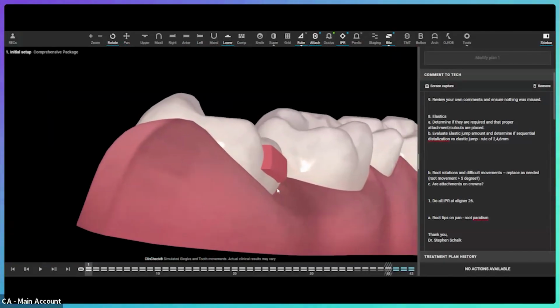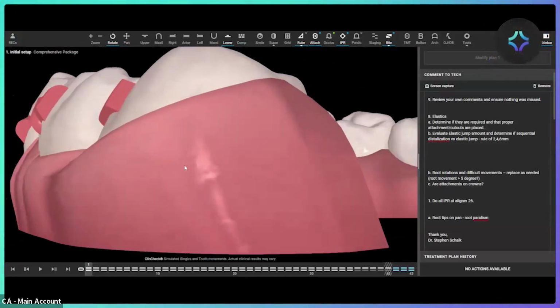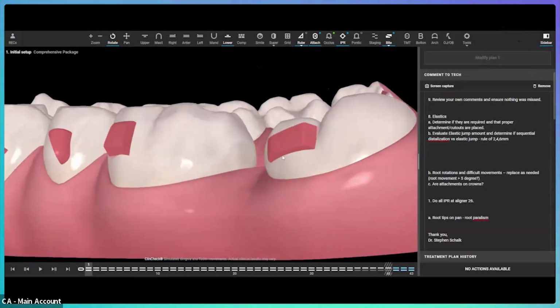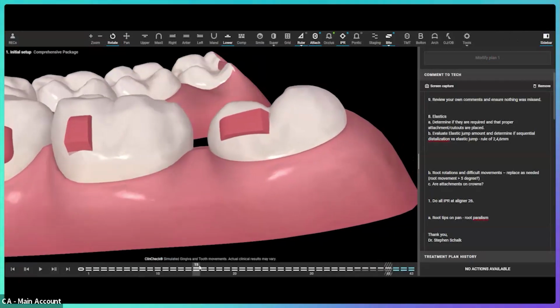Allows the trays to grip underneath in this mesial area. Again, if you want to see how this is treated successfully using aligners, check out the attachments and biomechanics course and you'll see a full breakdown. But what I really would do differently now, if I was doing this, is I would not close this space entirely. I would instead work on the root movement only, and I would keep the same amount of space. So the root would move, but not the crown. And it might take me 3 batches or 4 batches of trays to be successful with this, but I would eventually accomplish that.